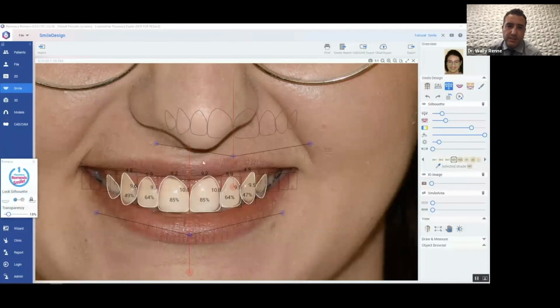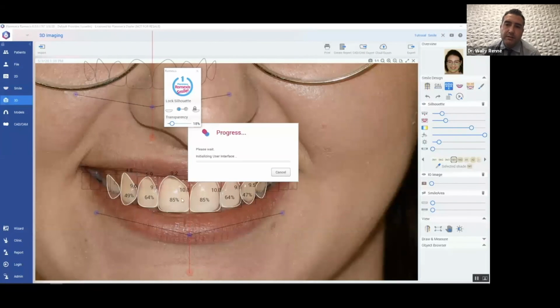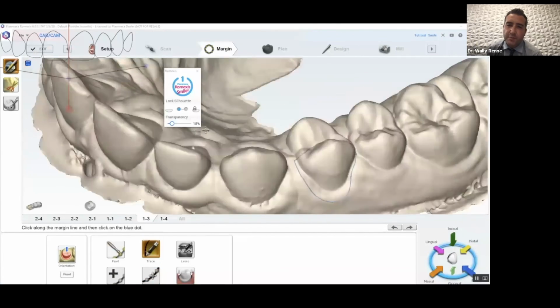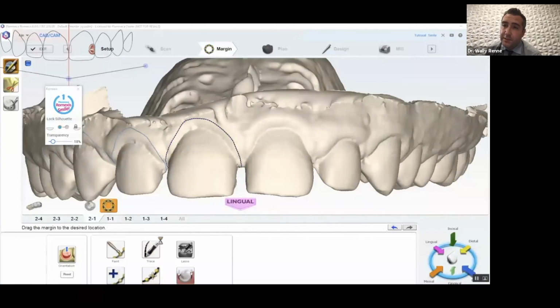But here's this little silhouette. By the way, you guys notice the midline deviation. A midline deviation of 2 millimeters is considered unnoticeable by most people. So not an issue. If there's a cant to the midline, then we have real issues.